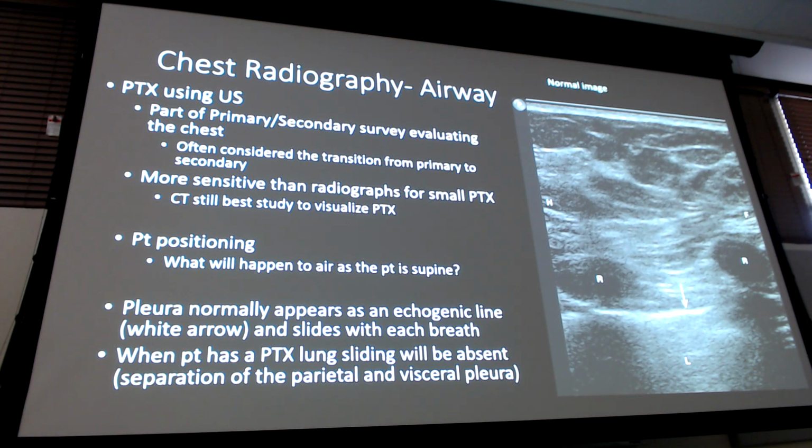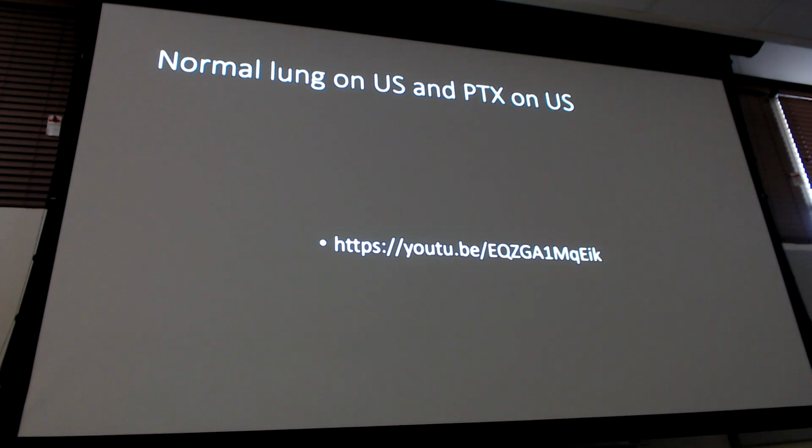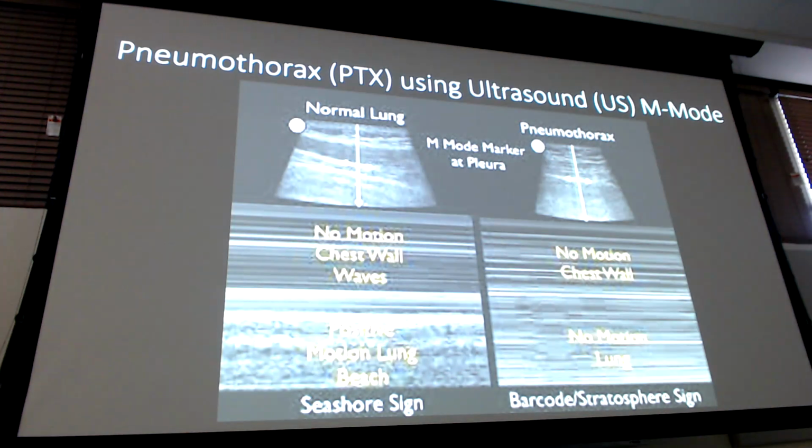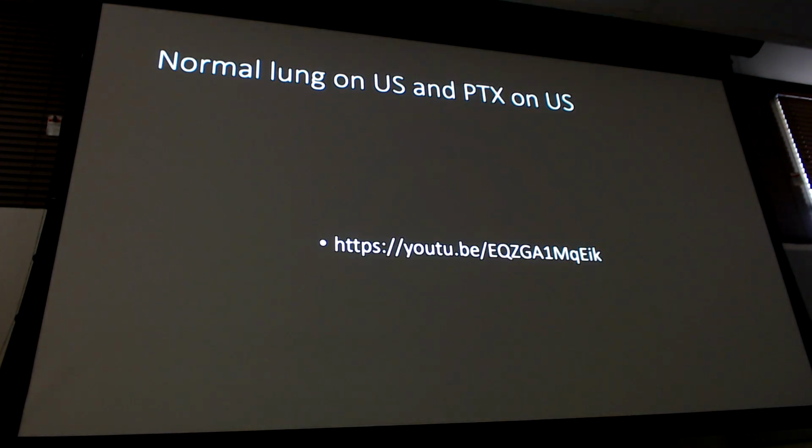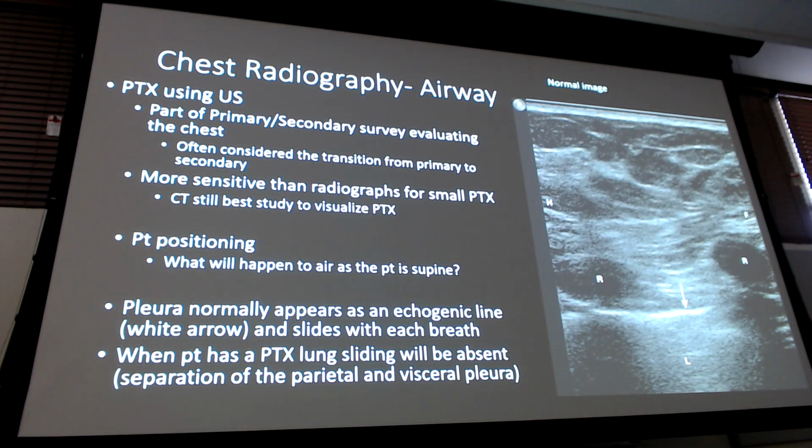Lung. Okay? There's a YouTube video. This is the one I want you to focus on. The reason you need this is because when you're doing your EFAST and your ultrasound, you are finding this picture. Then when you switch to M mode, you get a little line that lines up, and you have to place that line where you want it to detect the motion.